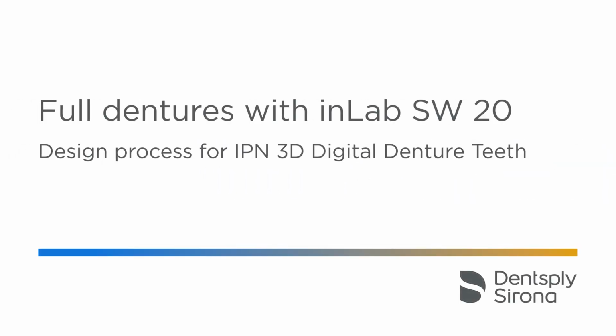Welcome to this video tutorial with the topic Full Dentures with inLab Software 20. Design process using IPN 3D digital denture teeth. In this video, we will show you how to design, finalize, and export a digital full denture.